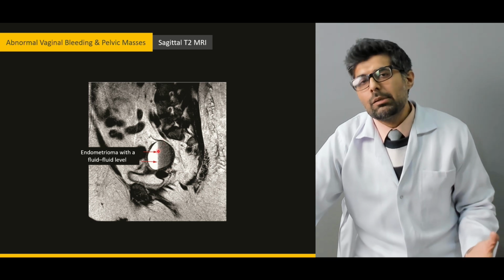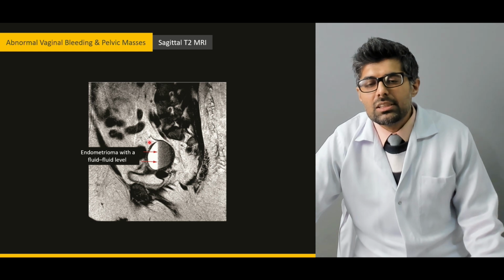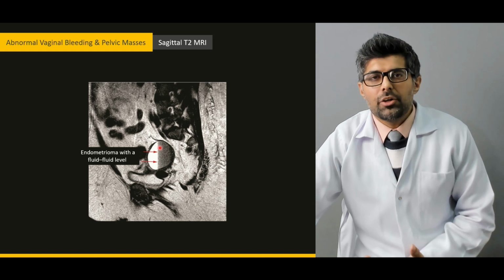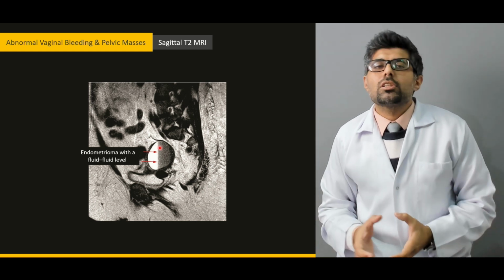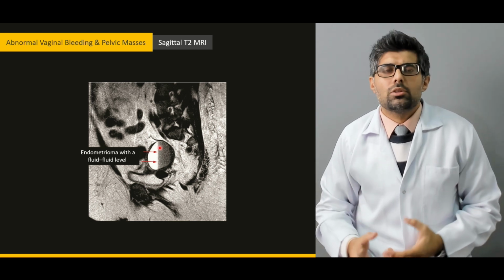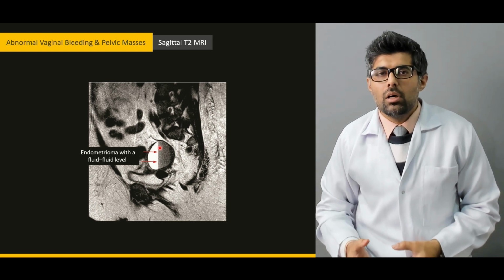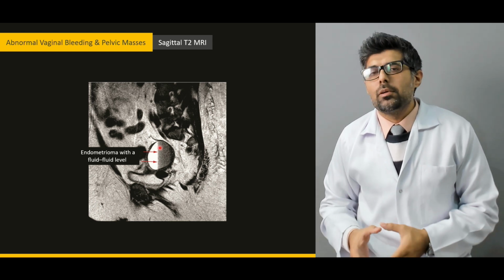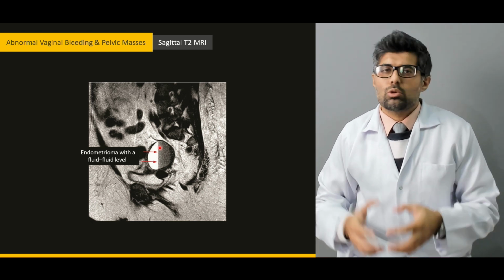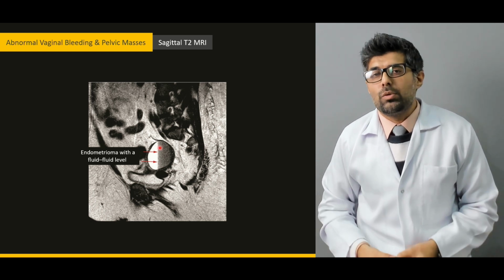Now, the previous image was of ultrasound nature. This is an MRI. When I was explaining the modalities, I said that ultrasound is the first choice whenever a mass or a problem is found inside a female patient, but it is never confirmed through the ultrasound. In order to confirm the diagnosis or any kind of suspicion, MRI is always done.